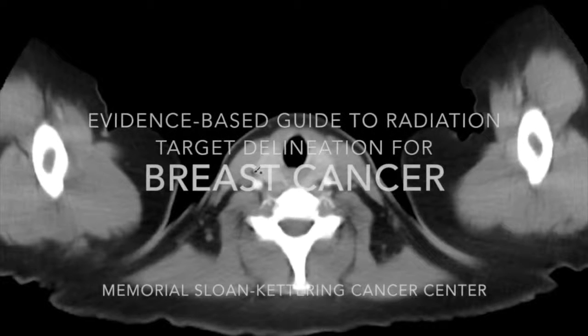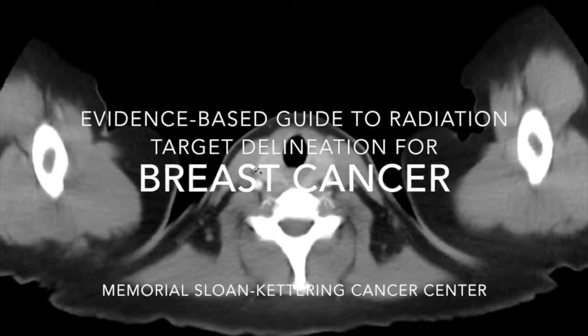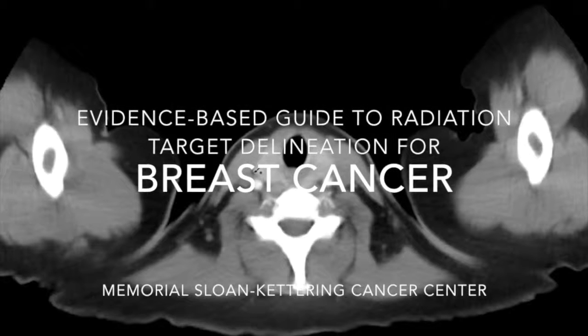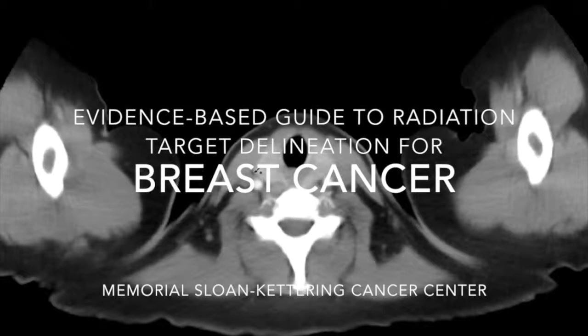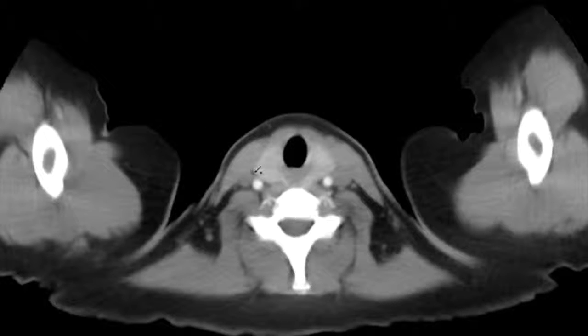This is a 5-minute evidence-based guide to breast cancer nodal target delineation based on 275 separate local regional recurrences mapped from 161 patients who had detailed imaging at the time of their local regional recurrence.